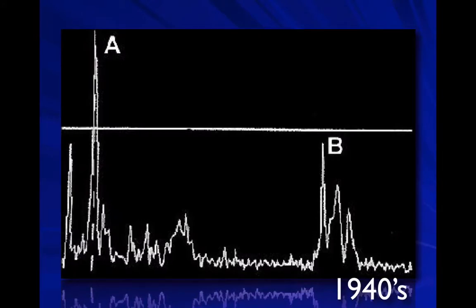And obviously, as technology advanced, things got a little bit better. But the initial imaging that we got from ultrasounds is basically, we're plotting distance to objects. So you see it's kind of rudimentary, not really clinically interesting. But this is the beginning of ultrasound.